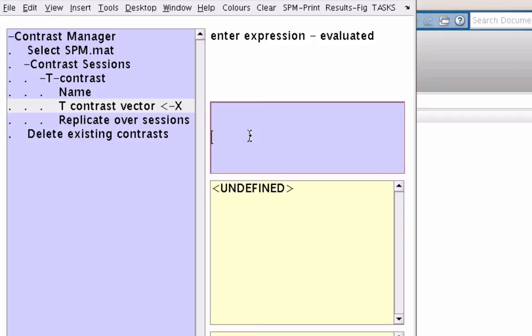Here is why I recommend you have equal number of sessions between subjects. What we in general want to do when calculating these fMRI contrasts is make sure that the positive weights for one regressor sum to +1, and the negative weights for the other regressor sum to -1. The reason for that is because we want to be taking the average across all those different sessions, because then when we compare across subjects, we're taking the average, and it's a little bit easier to interpret than if we just use 1 and -1.